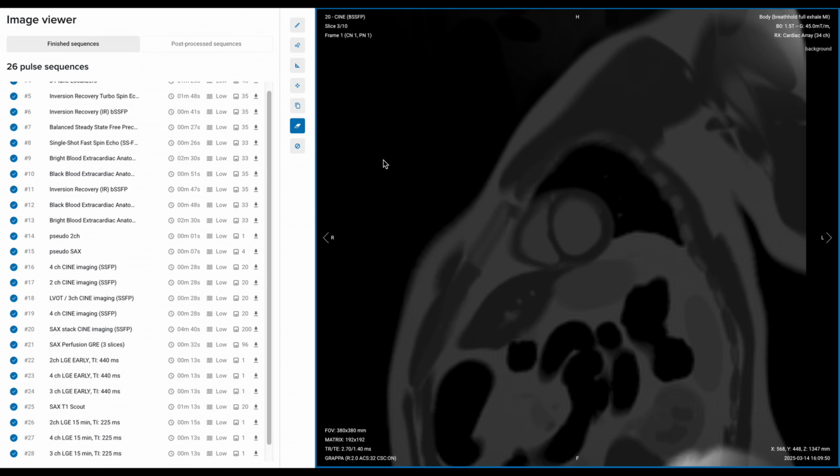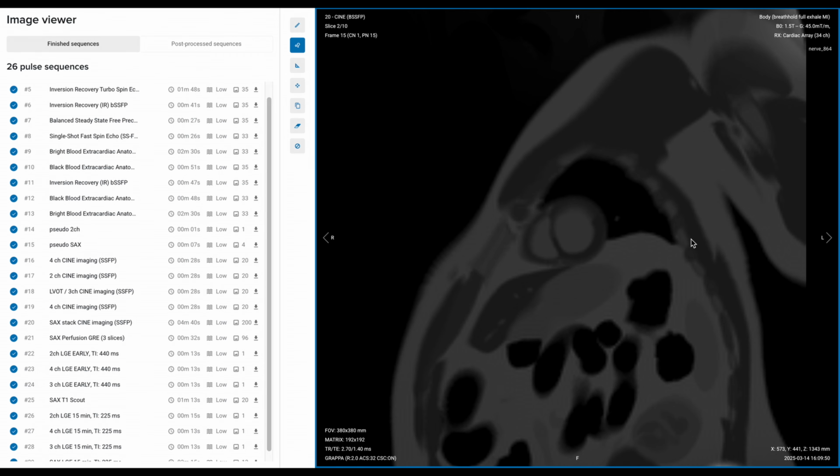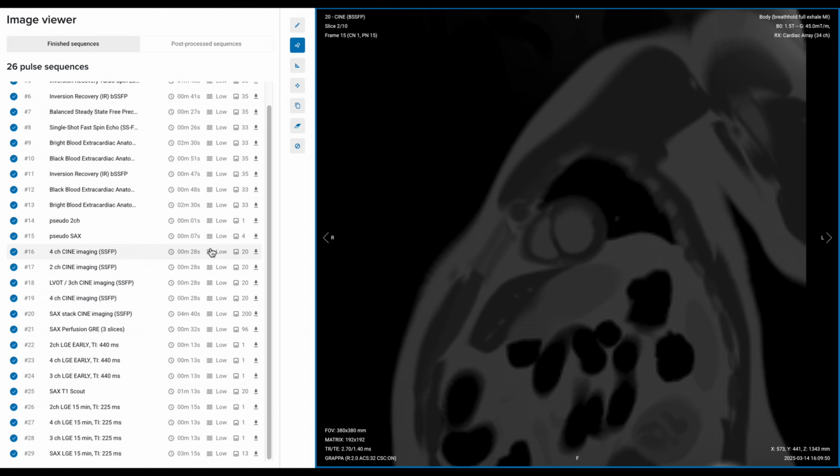Your main focus is to be sure that whatever you see in the myocardium is real, that it's actual scar tissue from gadolinium and not artifacts. Sometimes, to confirm this, you'll need to do a phase swap on your short axis, 4-chamber or 2-chamber views. This helps verify that the bright signal really matches disease and isn't caused by artifact.